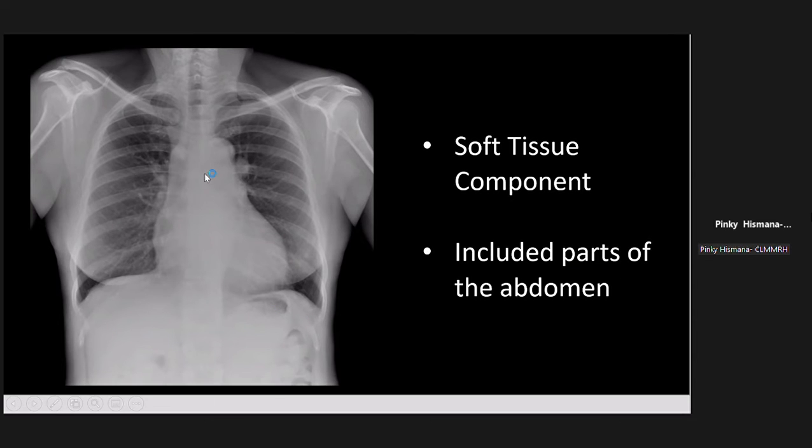Usually in radiology, when we refer to the thorax, we refer to it as the right hemithorax, left hemithorax, right hemi-abdomen, left hemi-abdomen. When you do a chest x-ray, you only see usually the right upper hemi-abdomen and the left upper hemi-abdomen. So you check also all of this. What's included in the image should be checked also, not only the lungs.